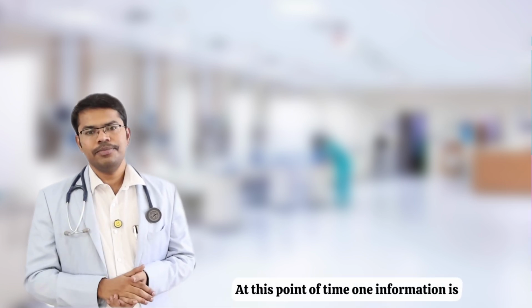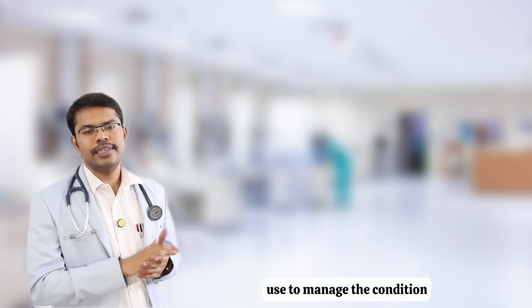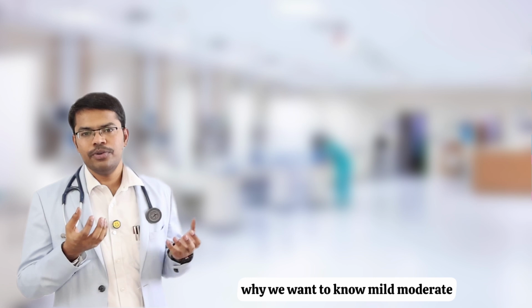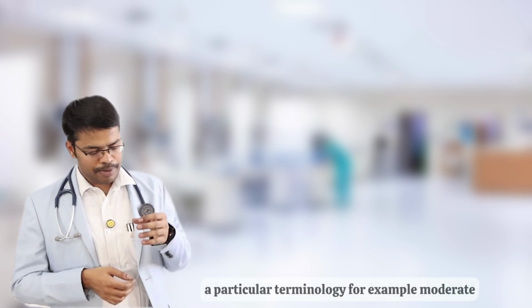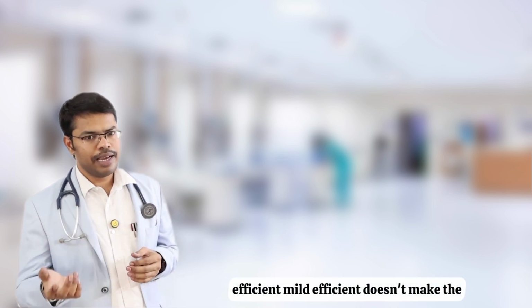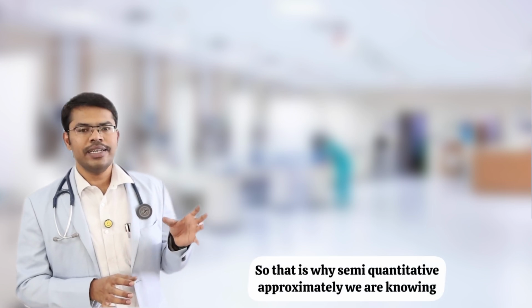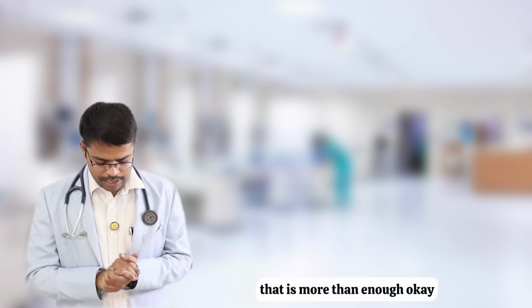At this point of time, one piece of information is that echo is the most common modality we will use to manage the condition. Why do we want to know mild, moderate and severe? Because we have to manage it. A particular terminology, for example, moderate effusion or mild effusion, doesn't make a difference unless we are treating it. So that is why semi-quantitative, approximately knowing, is more than enough. To follow it up or to see the response, that is more than enough.